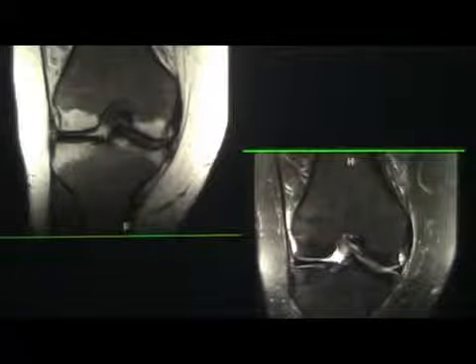So here's another case. Looks pretty ugly, right? A lot of marrow signal change, minimally bright here. If again you compare with the muscles, comparing this versus this, this is a little brighter. If that doesn't reassure you, you can go to the other images. You can do in and out of phase images like you do for adrenal. You look for small islands of fat, or you can look at plain films. With this much marrow change, there should be plain film changes. Sometimes not, but you look for that.